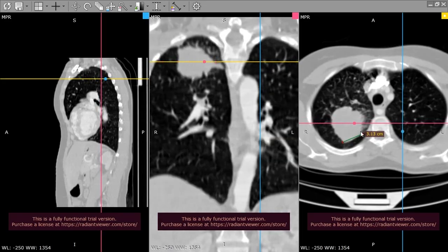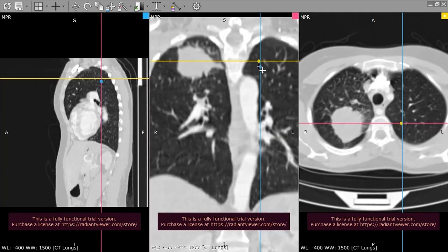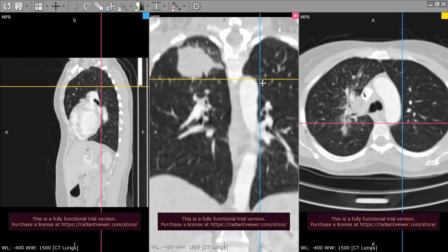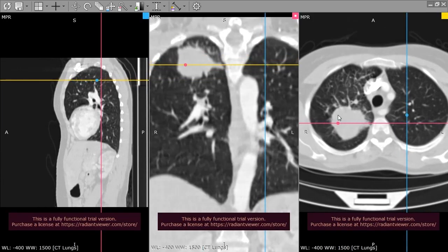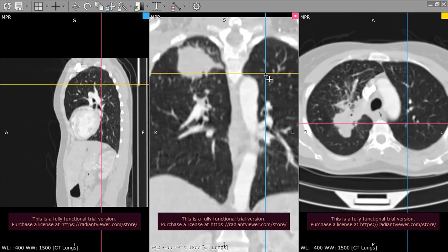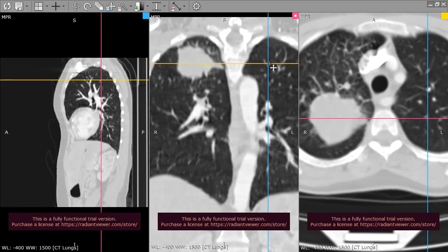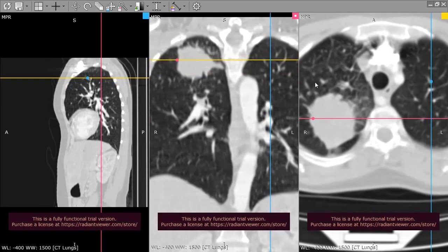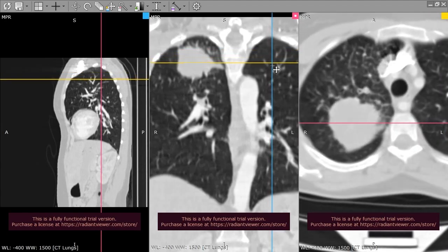You can see the surrounding of the lesion. The lung is totally unclear. There is septal thickening around it. Look at the difference, the asymmetry between the right side and left side. Also there is bronchial wall thickening here. This is called lymphangitic spread of the tumor.